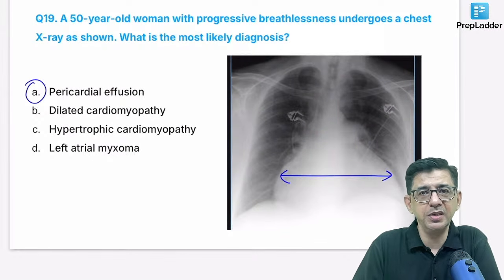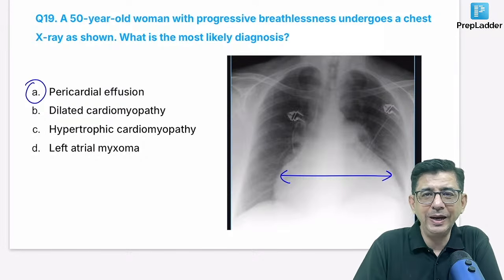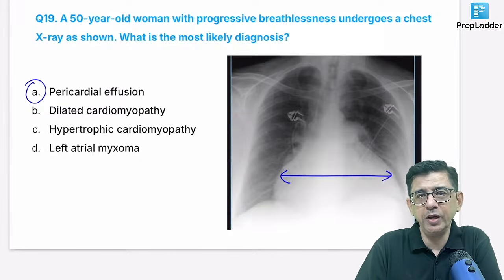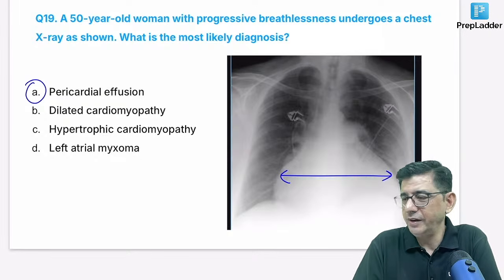The cardiothoracic ratio is increased. That's why I was saying the words electrical alternans. And I was saying that the patient can develop a hemodynamic compromise and then can end up with the diastolic collapse of the ventricles as well. So we are sorted for today.